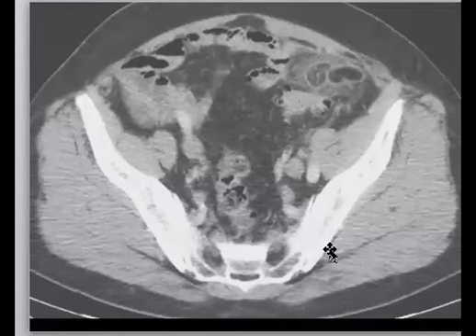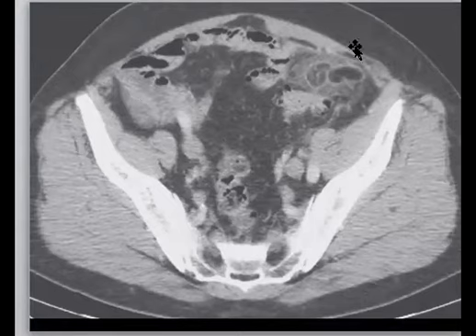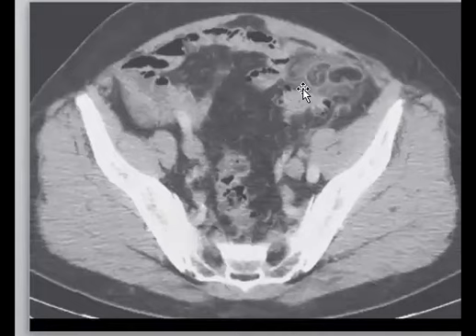This one is a very famous case, like the opposite of appendicitis on the right side. So it is on the left side. So this is what is called epiploic appendagitis. It is like a torsion of one of the appendages of the colon, and some ischemia happens. So you can see the stranding around this appendage, and the most common site is the sigmoid.